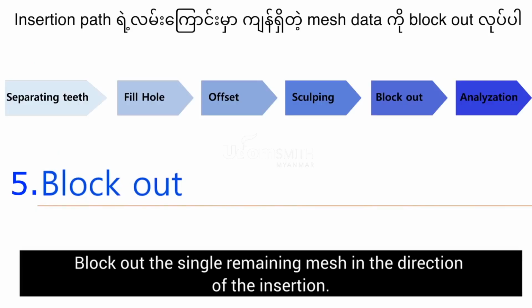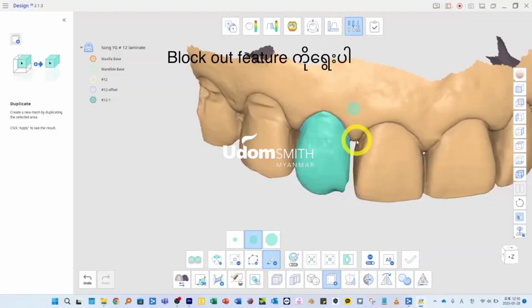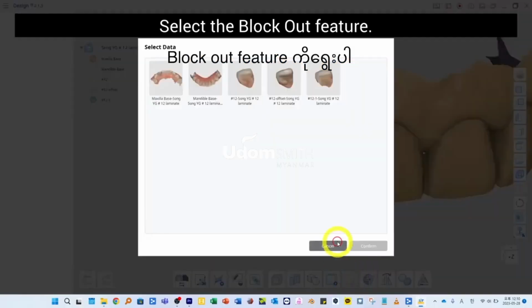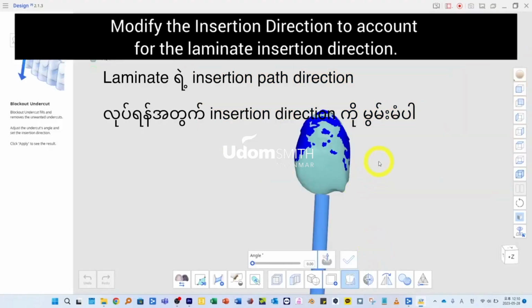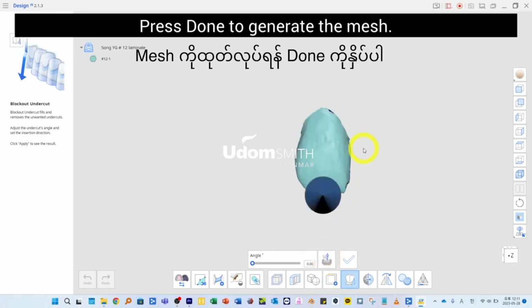Block out the single remaining mesh in the direction of the insertion. Select the Block Out feature. Select the second duplicated mesh. Modify the insertion direction to account for the laminate insertion direction. Press Done to generate the mesh.